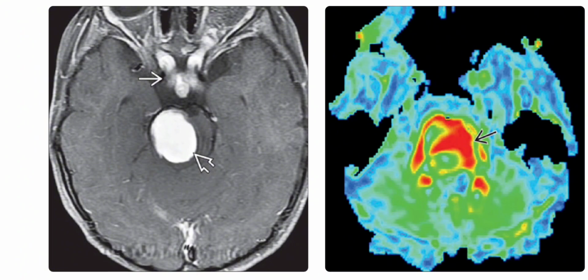Biopsy of the pontine lesion showed pilocytic astrocytoma, that is WHO grade 1 tumor, with no evidence for malignant degeneration. These pilocytic astrocytomas are quite vascular neoplasms, and they often exhibit a malignant-like spectrum on MRS, so don't be confused or don't be fooled by it.